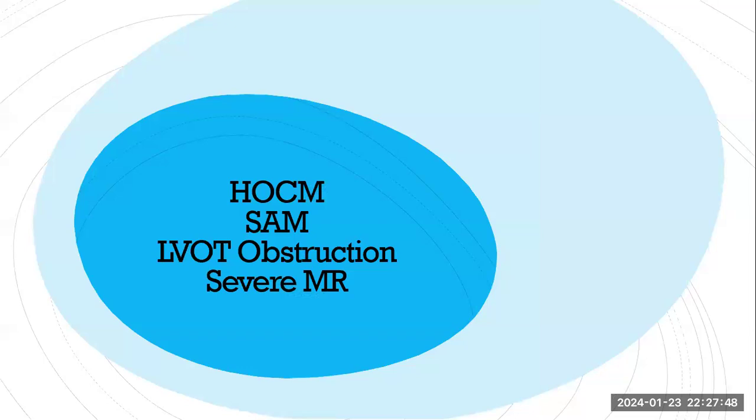But to say that this is significant, then either resting more than 30, or with any provocation, or asking the patient to do Valsalva, to reach more than 50 millimeter mercury. So if you were able to get one of them, this is in favor of severe HOCM or obstruction. Either at rest 30 or with a provocation more than 50. Thank you.